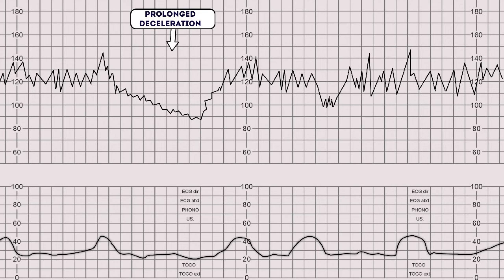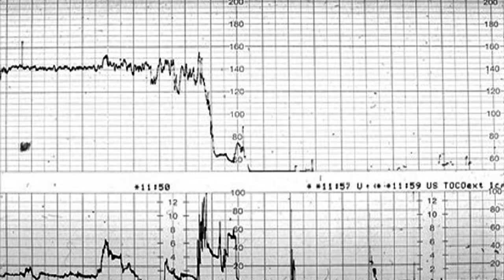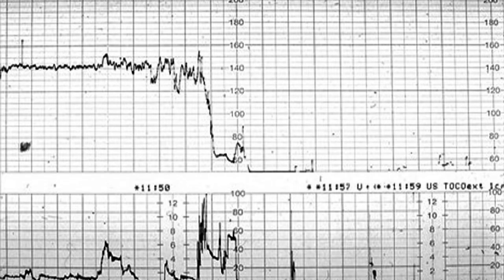Should do urgent intervention. Should exclude acute events like ruptured uterus, placental abruption, or cord prolapse. Do conservative measures. Contact the seniors. Contact the OR to prepare for urgent cesarean section. If resolved within 9 minutes, you can consider expediting labor or continue observation according to the shared decision with the senior and the mother. The next and last trace, I will give you 10 seconds.